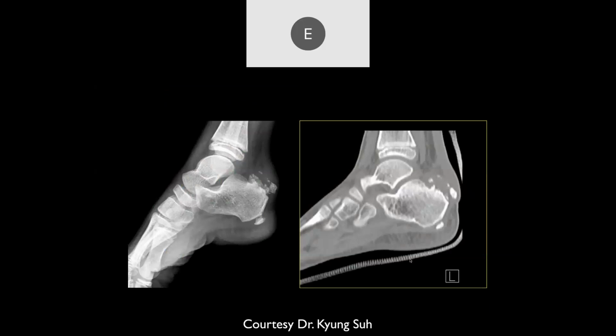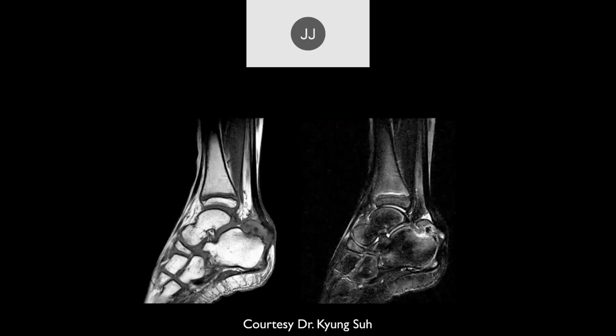And then here we can see further images where it looks like there's been an avulsion fracture almost, at the Achilles tendon insertion on the calcaneus. And then probably some injury also here, traction injury from the plantar fascia attachment. It reminds me of a ballerina.